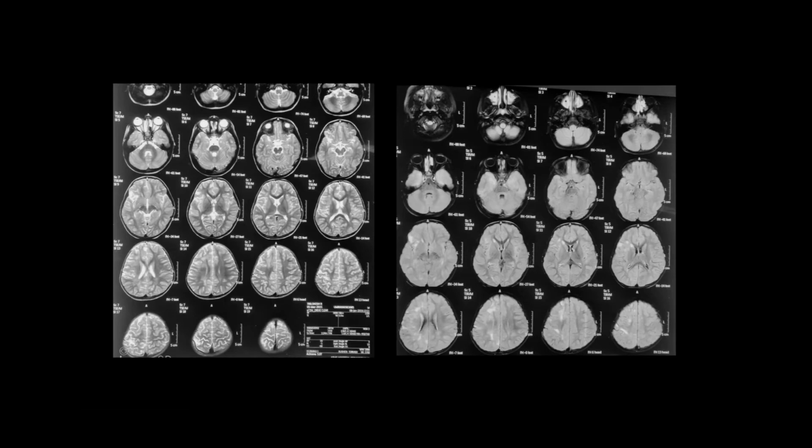We have external films, T2 and FLAIR, and you can see maybe better on the FLAIR. There are these multifocal, patchy areas of hyperintensities, predominantly in the right cerebral white matter in the subcortical regions, and also in the posterior periventricular regions. Some abnormalities are also demonstrated in the left posterior periventricular region. The cortex is also involved in the right frontal and parietal region.